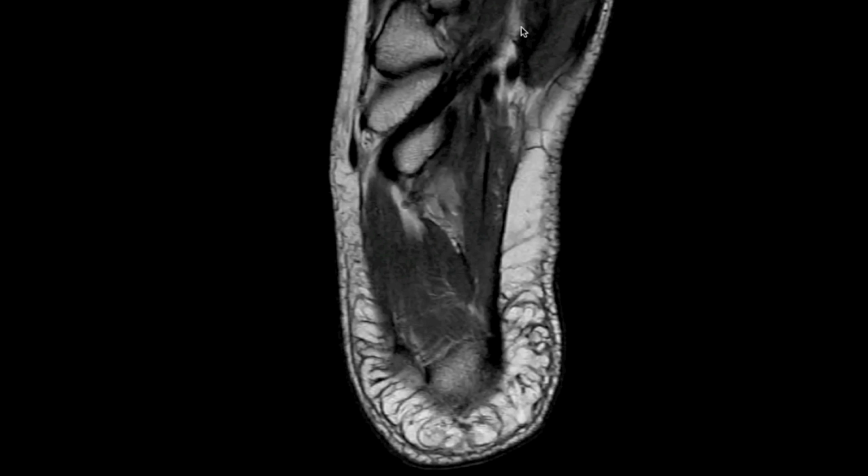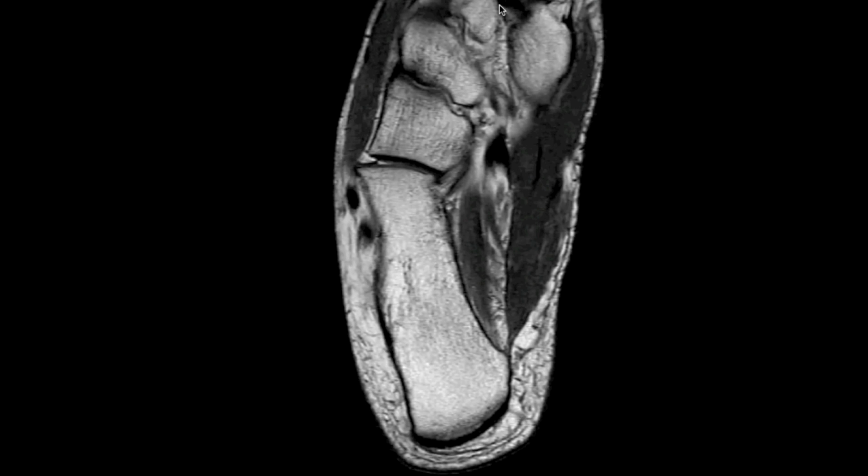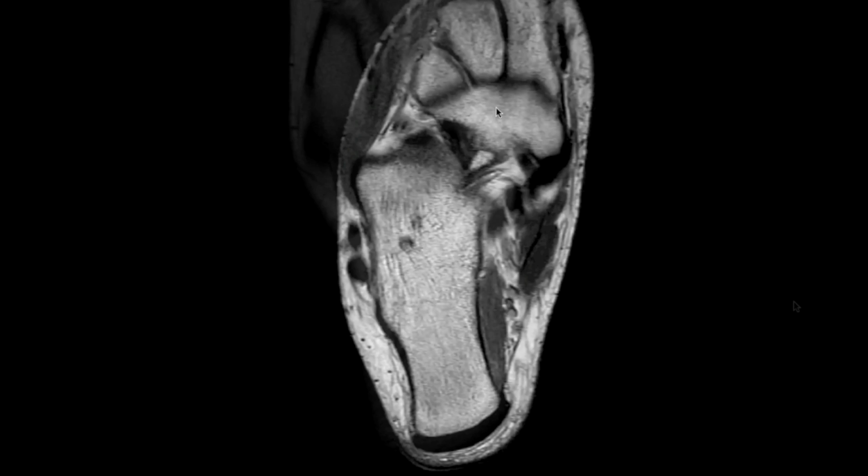And then finally, another important landmark is the medial base of the second metatarsal, because from it there is a ligament which arises in it and goes medially to attach into that first cuneiform. This is known as Lisfranc's ligament. And Lisfranc's ligament has itself three components. There is a dorsal, an interosseous, and a plantar component that we don't see to advantage on our routine field of view for ankle. For that we would need a dedicated midfoot.